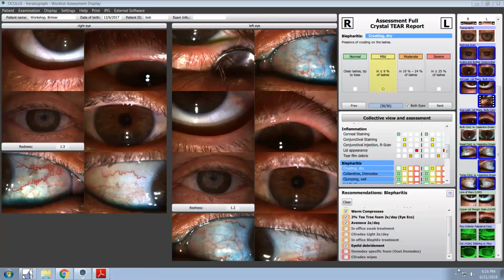And that pretty much sums up just a quick overview of the CrystalTear report. And I thank you for taking your time to take a look at it.